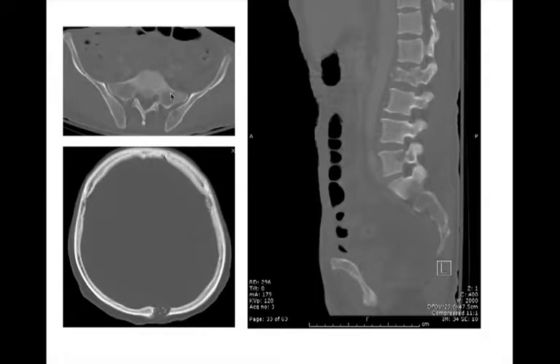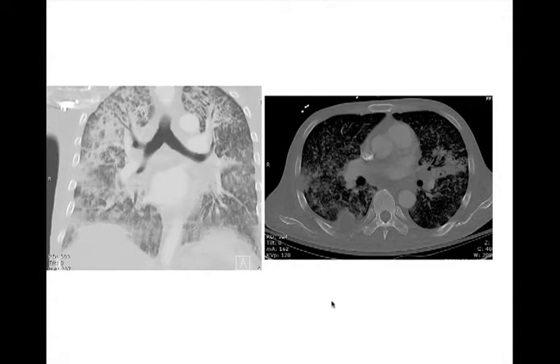They had multiple lytic lesions in the pelvis, as you can see, in their skull, in their spine, causing a compression fracture, one here. So I think you certainly look at this and you say, hey, does this patient have some kind of lung cancer that's just diffusely metastasized throughout their lungs and giving them bone mets? And that's certainly probably the first thought you're going to jump to.